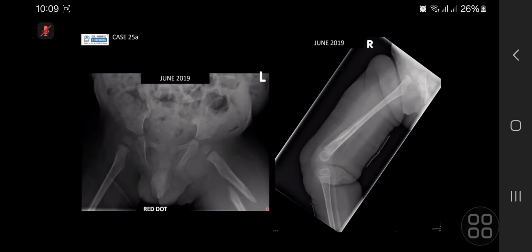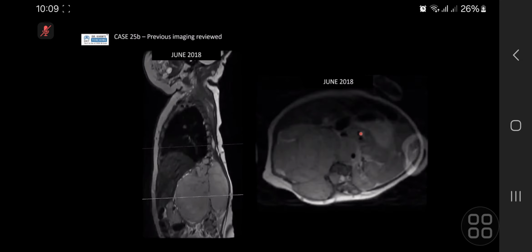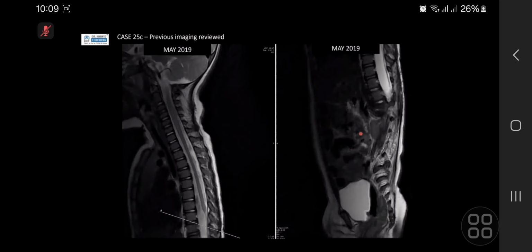The reason why I've shown you this is because this is actually a type of insufficiency fracture. Now, you wouldn't be able to tell from the first instance. All you can say is that there is a displaced fracture on the left and periosteal reaction suggestive of a fracture, but an underlying bony process, malignancy cannot be excluded. Do an MRI to characterize, but I think on the other view, which I may not have shown, there was a cortical fracture with evidence of healing. So this just shows you that when you see neuroblastoma, the first thing you think of is bone mets causing pathological fracture. I think the next image that I show you is that the patient's been treated.